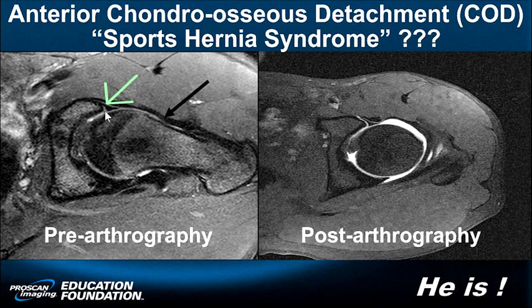Now we are in the anterosuperior quadrant. You don't get deep fissures and sulci up high. Those are down low. So we said, that's a tear. His orthopedic surgeon said, I don't believe it. He's got no hip pain.